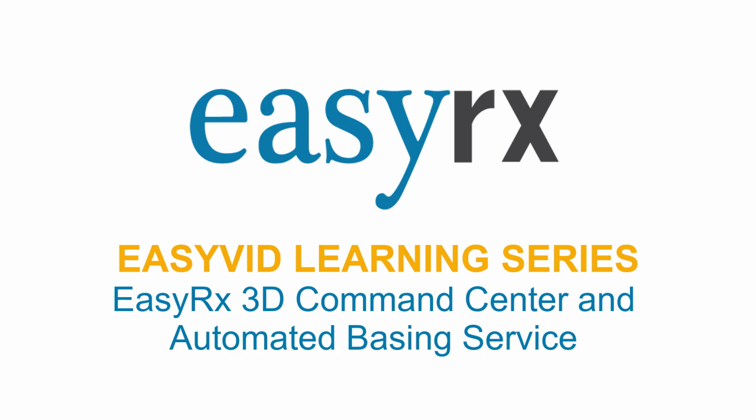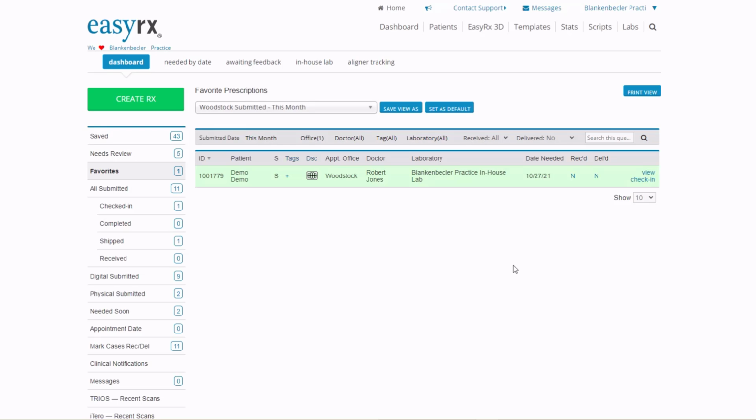Welcome to this EasyRx EasyVid on the EasyRx 3D Command Center and how to use the EasyRx 3D automated basing feature. We are currently logged in as a practice. We will be using an in-house lab in this example, but the Command Center and usage is the same for a commercial lab account. To get started, let's set up our preferred default options.